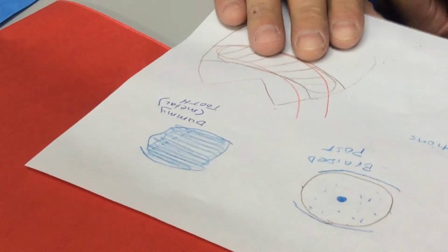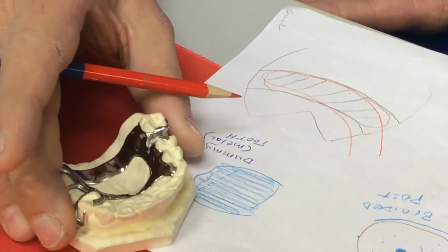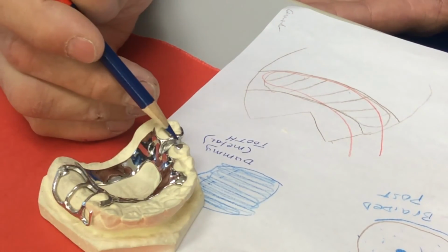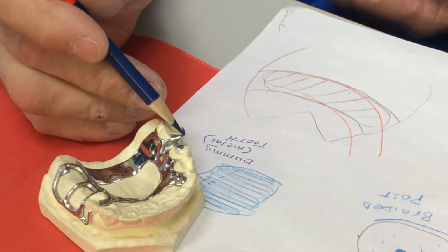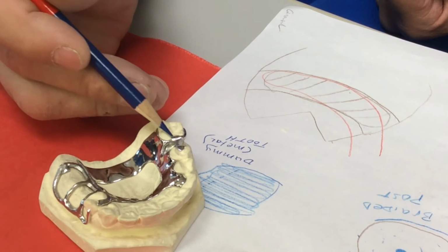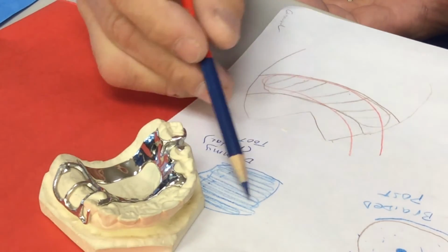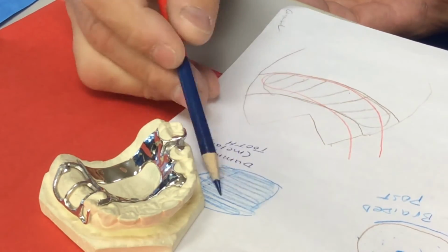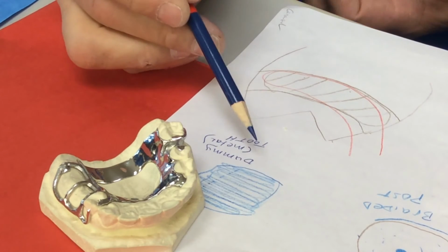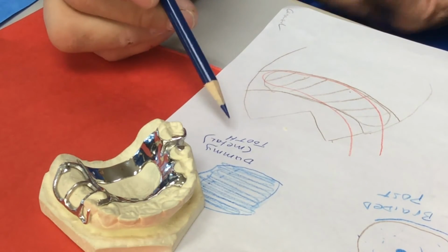Third choice is to put a dummy tooth in there. A dummy tooth is metal. It's basically going to fill this whole area when they cast the framework with part of the framework. It will have an occlusal surface on it that would meet with the opposing occlusion. The best I can tell you is to color it in your drawings in solid blue, indicating that it is all metal, and write that you want a metal occlusal or a dummy tooth.